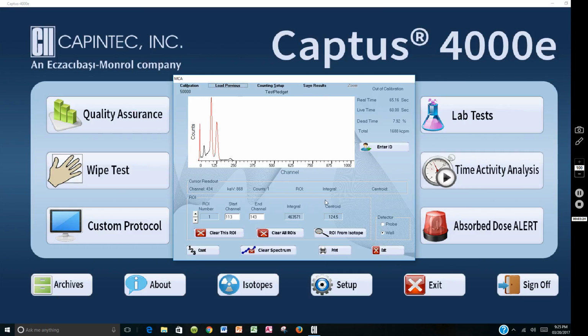Now we want to clear all the regions of interest, and we want to create a region of interest, say from about 100 to 300 keV. There's 2 keV per channel, so we would start at 50, and then 150 times 2 is 300, so we'd put 150 here, and then we would simply click over here, and it creates a new region of interest for us, covering the 100 to 300 keV range.